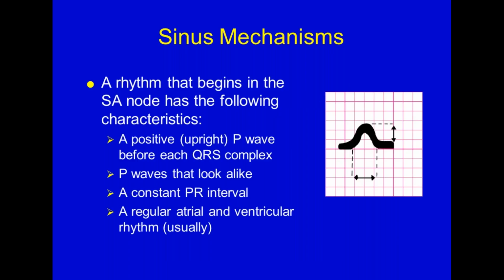So the regular sinus rhythm, and just so we're all clear, the rhythms you will look at for the next however many days we do this are all lead 2 rhythms. So lead 2 being the one that looks the closest at that conduction pathway from the SA as it goes straight down, all the way down the septum.